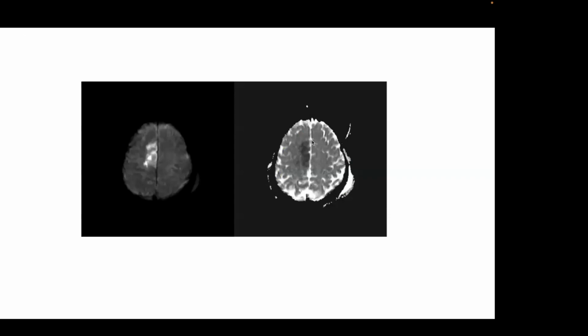Now, this patient did have a small infarct. Can anyone tell me how you can explain those symptoms, or what part of the brain is involved here? We haven't talked about this. I don't know if anyone recognizes this syndrome. This is supplementary motor area. Supplementary motor area is medial frontal.